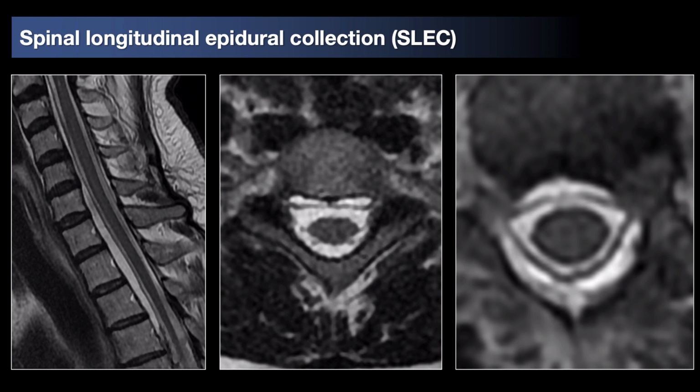So be on the lookout for that on your MRI as well, especially if you see an isolated little discal spur. But remember, it's not always the largest disc. If you're seeing more circumferential or dorsal fluid, it could still be a ventral tear because these patients are often lying dependently, or it could be due to a lateral fast leak, so a nerve root sleeve tear, or say a fast leaking diverticulum. Now, why is knowing whether a leak is leaking fast or not important? Because it helps to choose the right myelogram. With fast leaks, you're going to want some form of dynamic imaging, which has a high temporal resolution, as the leaks are quite literally leaking fast.